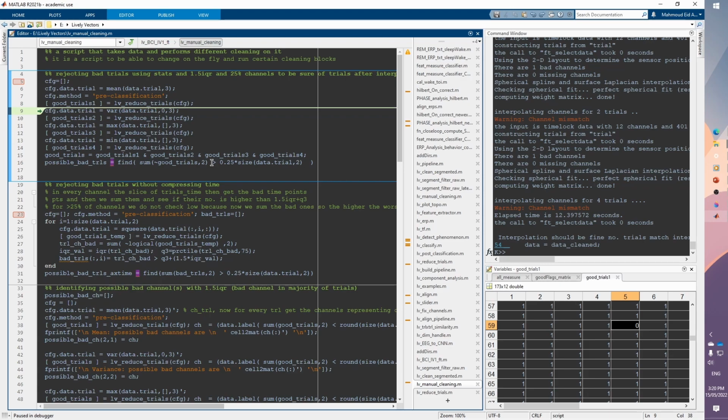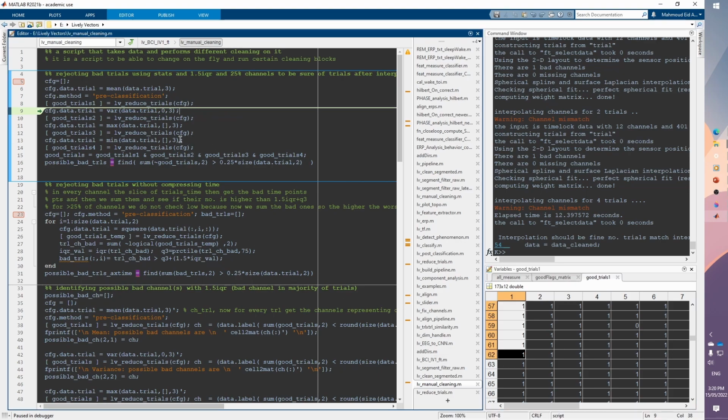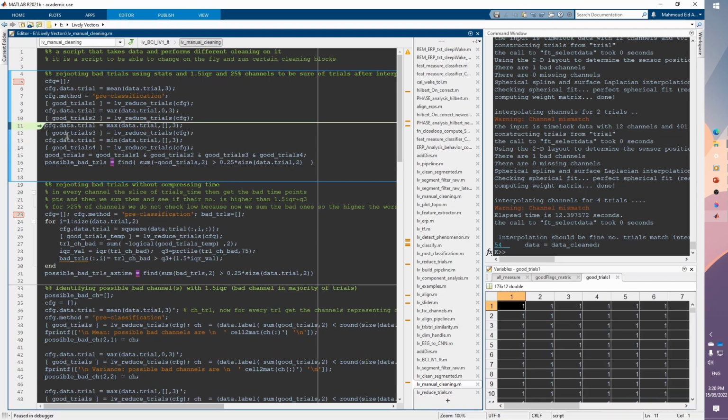It's looping on the second dimension, and you are creating the distribution based on the values of the first dimension. And so we can do this for the variance, and we can do this for the other measures as well. We can extract this for the variance in a different matrix, do this for maximum, and do this for minimum.